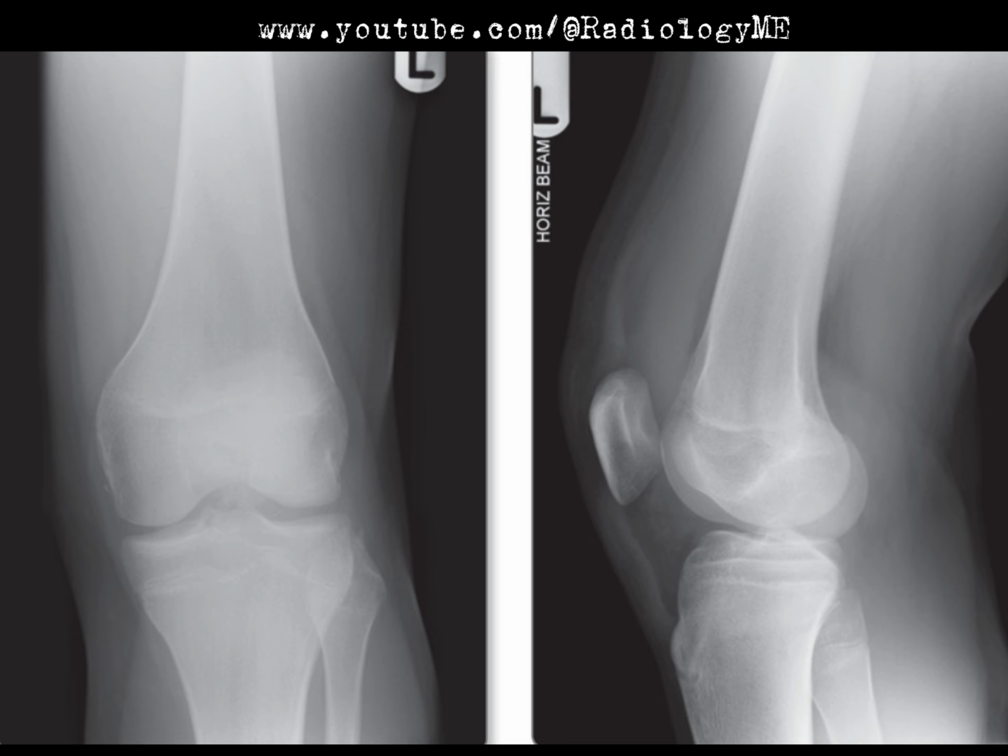Now, if you were sitting in an FRCR Viva exam, I can pretty much guarantee the examiners would have a few follow-up questions for you. For instance, they might ask, what's the significance of lipohemarthrosis? And the answer is that it's a sure sign of an intra-articular fracture. The fat from the bone marrow leaks into the joint space, mixing with blood, and voila, you've got lipohemarthrosis. It's a pretty reliable indicator when the fracture itself isn't immediately obvious.